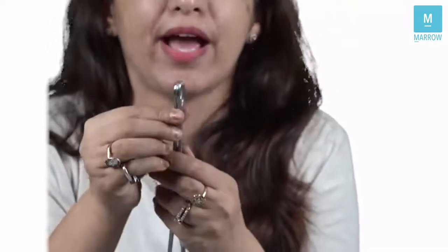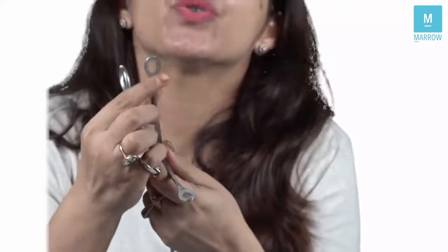Now, if you see its distal end over here, the distal end is ring shaped, right? And when you open the rings, you see serrations present on the rings, right? So it is ring shaped, it has a hole in the center, and when you open it, you see serrations.